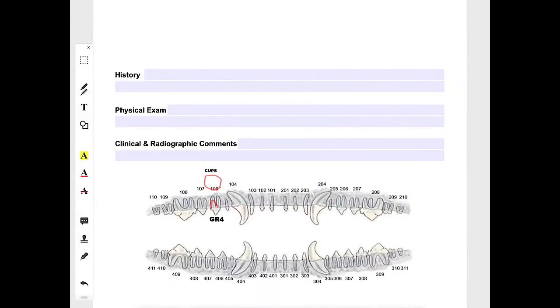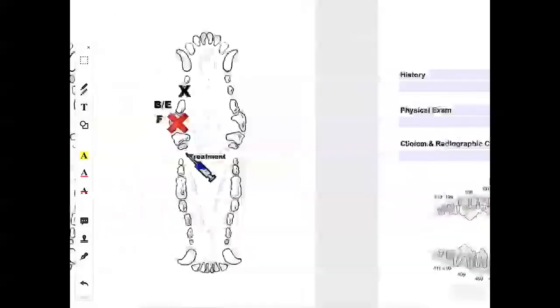If you'd like, you can do the other annotations again on this portion of the chart. Obviously, the two first pages of this chart together are equal to having all of that information on one chart. So all of this is going to be sent to the client. If you're a specialist, all this is going to be sent to the referring vet. So all the information is on these two pages mainly, and consequently you don't need to do everything on both charts if you don't want to. So there you go.